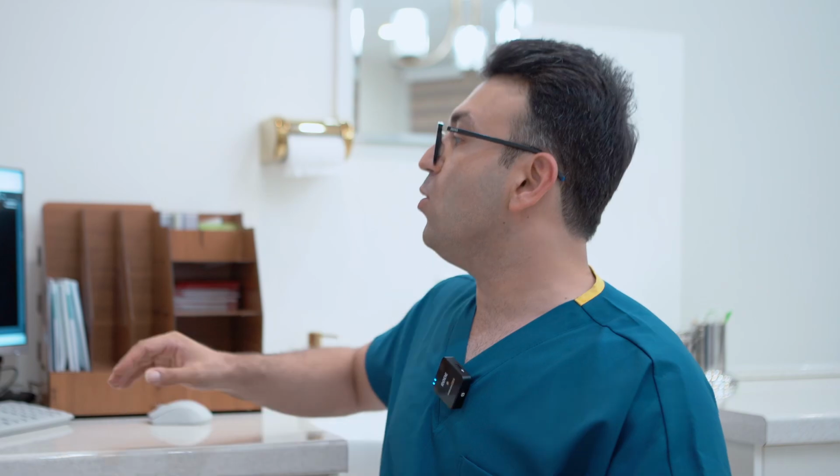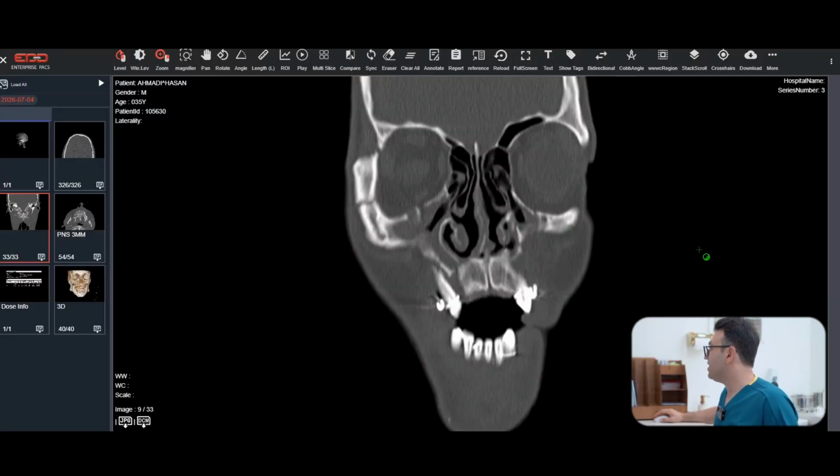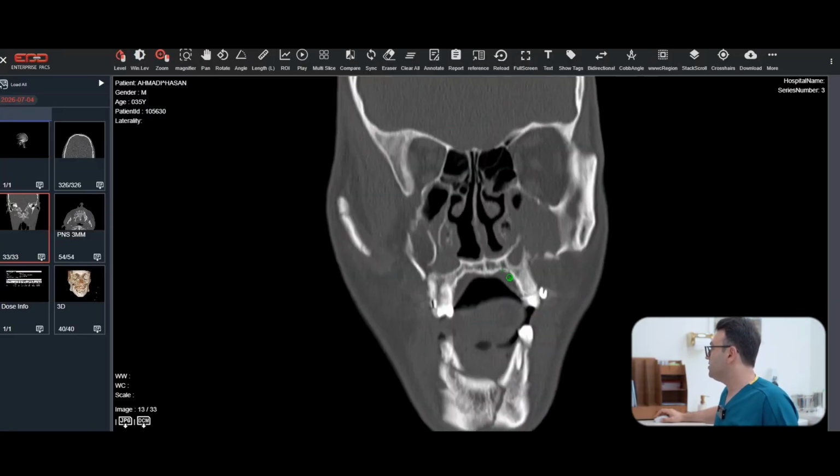For Le Fort one, you know the fracture line passes through the nasal piriform and the lateral wall of the maxillary sinuses, and that goes to the connection between the pterygoid plates and also the posterior of the maxilla.